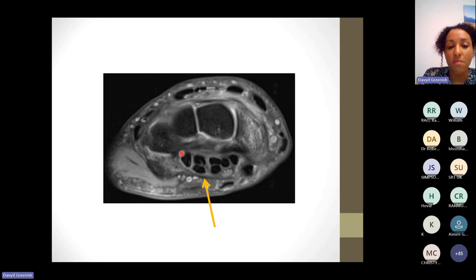And then you have more bunched tendons, and these are the flexor tendons. So this is the appearance of the carpal tunnel, essentially. Until you see it, it's not something that you would assume. So it's good to just see an example of each of one of these bits of anatomy, and then it helps to orientate and you can apply the principles.